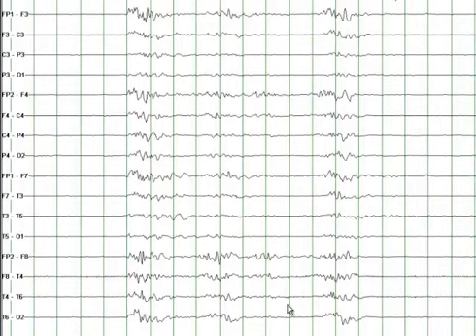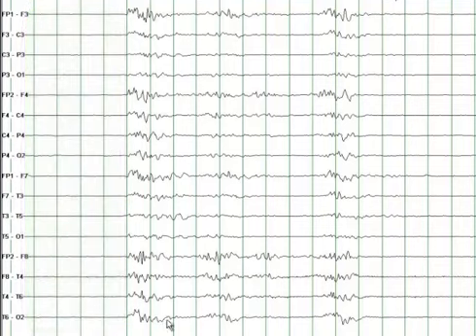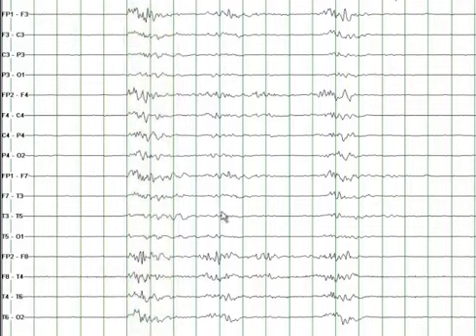This particular patient had anoxic brain injury resulting from a cardiac arrest that lasted for 20 to 30 minutes. You see periods of suppression with amplitudes less than 5 microvolts in a generalized distribution. Then you see these bursts that last for approximately 2 to 4 seconds with variable amplitude in different locations.